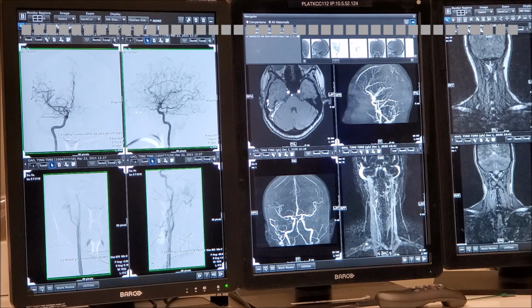There's one artery that we forgot to mention when we went over it. Yeah, so there is an artery that we don't often see traveling from midline to lateral. Okay, this one, right? Yes. Can you tell me where it is in the lateral view? On the lateral view, I think it goes along the tentorium. So that's called tentorial. We're going to debate about it.